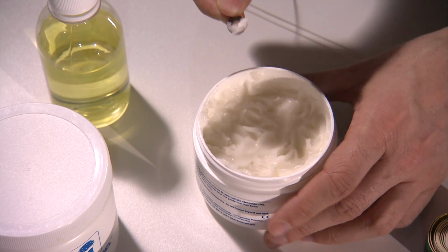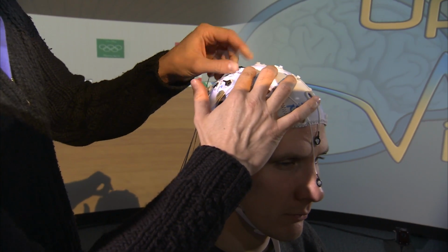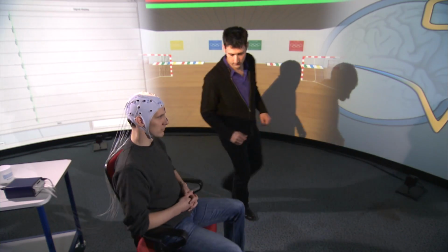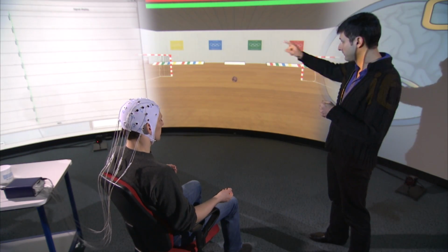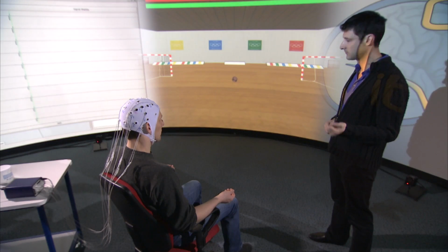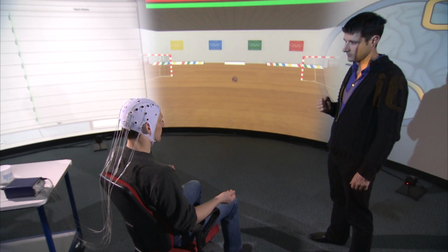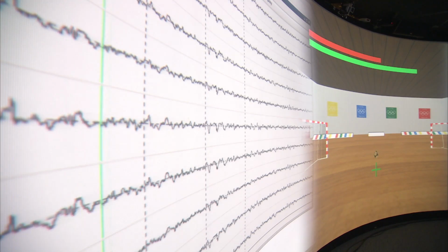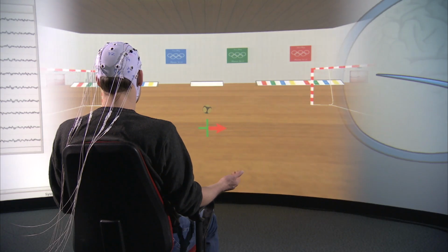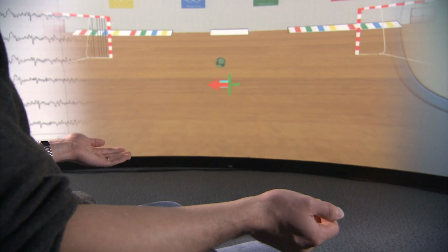In this second application, the EEG cap sensors are placed so they can receive signals transmitted by the brain's motor cortex corresponding to hands. This time, the goal is to send commands using EEG activity observed during left or right hand movement. After using BCI to identify the frequencies used to move each hand, the OpenViBE software can now detect a right-hand movement command that makes the ball go to the right and a left-hand movement command that makes the ball go to the left.